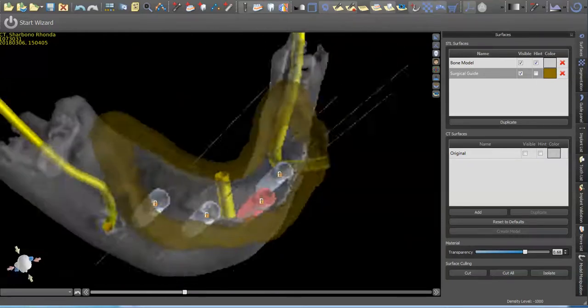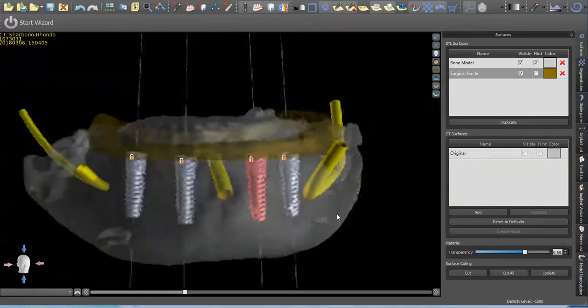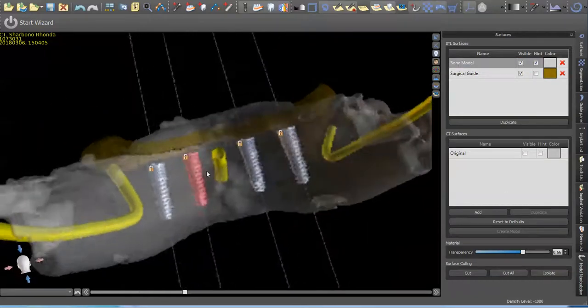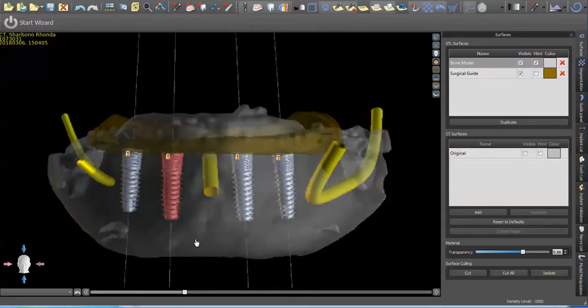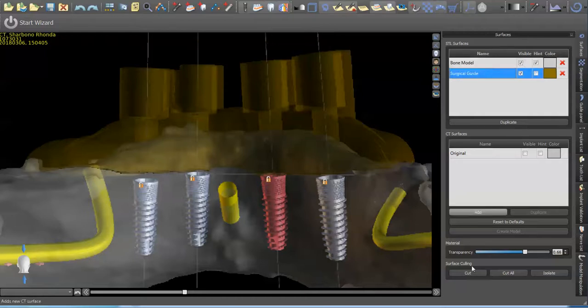And this is what it gives you. It'll give you a bone reduction guide into this area. So now what I'll do is I'll click on this and then kind of follow the same line. Actually, I'm going to back up a couple steps and do the same thing. I'm going to press on cut for the surgical guide.